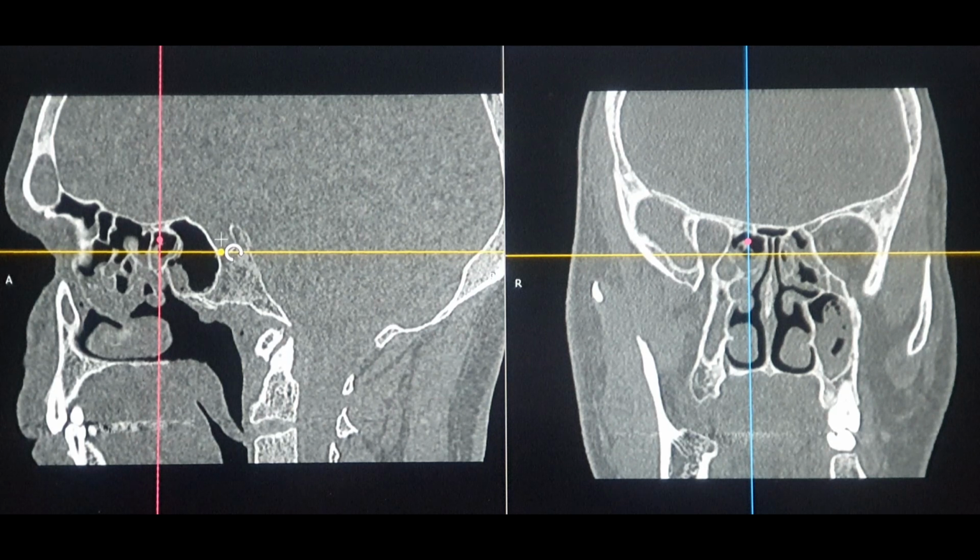Now I've shown this in 3D anatomy in my previous lecture as well. So this is the clivus bone of the sphenoid, and we can have the cervical vertebrae over here. So this is the maxillary bone, and that's the socket for the mandibular bone. This is basic sinus anatomy you can locate on the sagittal scan. That's the patient's choana, and that's the patient's nasopharynx, which has a soft palate over here. You can see the soft palate, and the ridge which differentiates the oropharynx from the nasopharynx over here. So this is the anatomy which you can see on the sagittal section altogether.